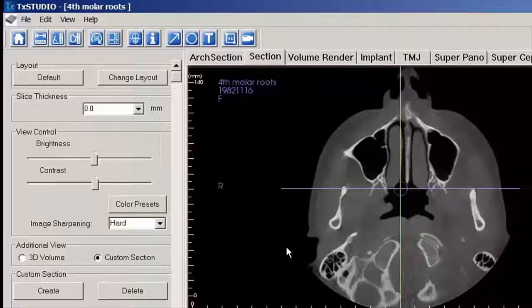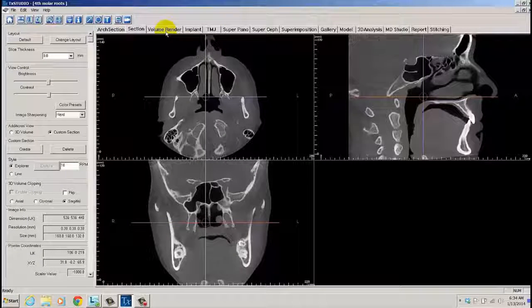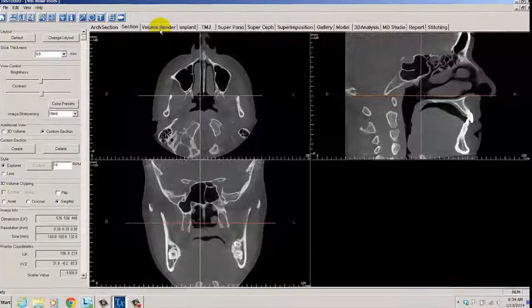And if you would like to remove any of the text in the viewing windows, select the eye on the toolbar. So let's go up to the top. We'll find the eye, and you notice the text on the windows. We'll click eye, and it will go ahead and remove that. Now there will be a patient name stamp in the upper left corner of any view sequence movies that have been produced. Next, you may wish to move the slider bars until the slices are found that you would like to use in your transitions.